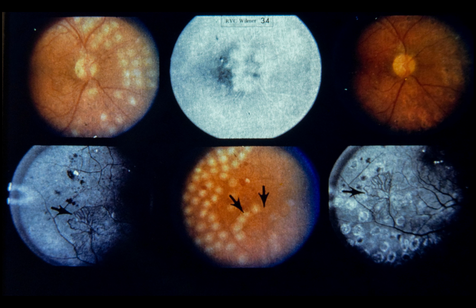Comment: in some instances, scatter photocoagulation treatment will cause regression of retinal neovascularization as well as disc neovascularization. This case demonstrates, however, that in some patients, focal treatment to retinal neovascularization may be required to obliterate retinal new vessels and thereby reduce the likelihood of vitreous hemorrhage.